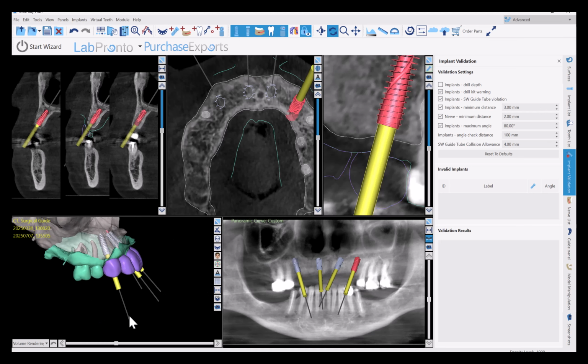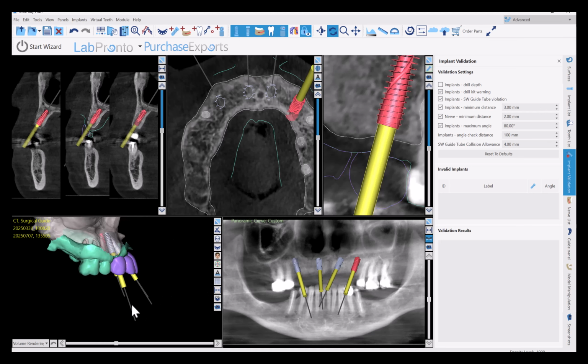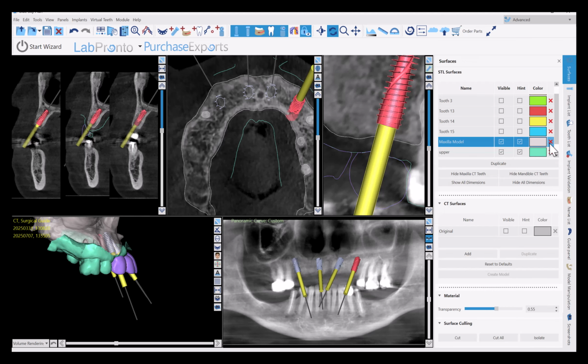And bear in mind, I am not committing to this. I'm going to go ahead and make a guide, but before I ever commit to having someone use this guide, we're going to go back, verify centric, pictures, the wax-up, see if that changes things. It may or may not, but if it doesn't, at least I'll already have a guide made. So hypothetically, if this could all stand as is, now I'd be ready to make a guide.